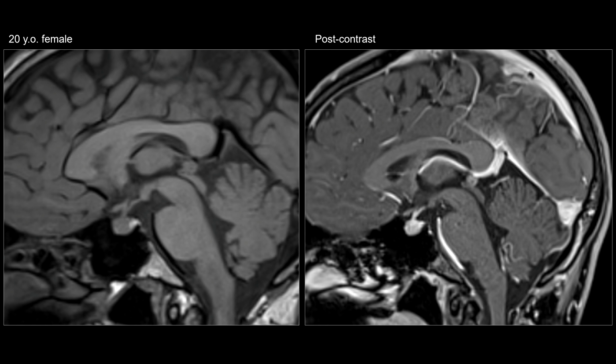Now, this is an example of a young, healthy patient. You can see before contrast is given, you can separate the anterior pituitary gland from the posterior T1 bright spot, the neurohypophysis. After contrast, though, the entire pituitary gland as well as infundibular stalk should enhance homogeneously without a focal lesion. So that's anterior pituitary gland, posterior pituitary gland, stalk, and optic chiasm.